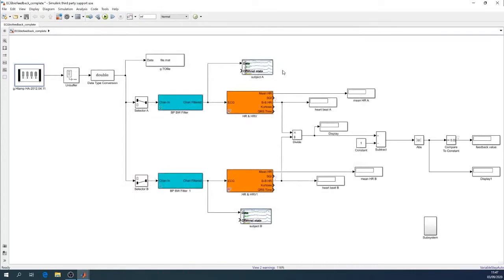Then you usually use the scope for everything you want. If you use the G scope, it has a bit more features. You know, it has the auto calibration. You can change the time base easily, the amplitude as well. You could, for instance, it's not the case here, but if you have EEG signals, you can arrange them as a head layout.